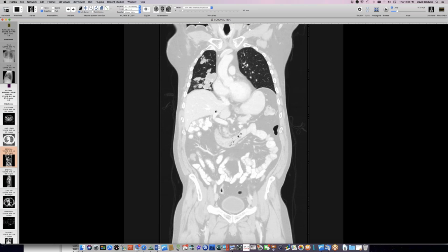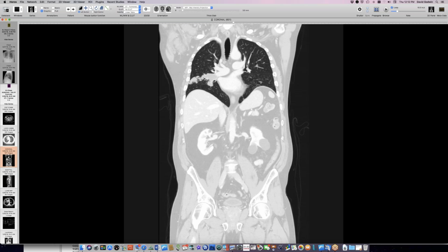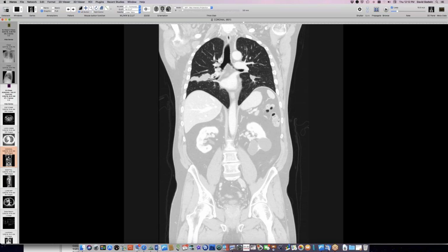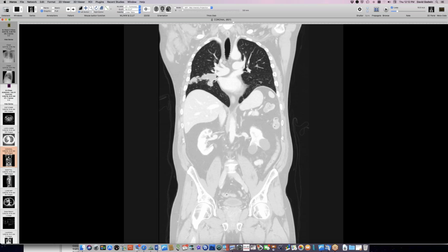Now, I went back to an earlier study in 2016, about 2 years before, and there were mostly peripheral lesions. So I think what happens is that the metastases probably lodge distally, where their caliber interrupts the pulmonary artery flow, and then they grow retrograde back up through this big empty space, getting blood probably from the pulmonary artery flow as they go. So I think they probably start peripherally and then grow centrally like this, just given the way small metastases would go out more to the periphery.